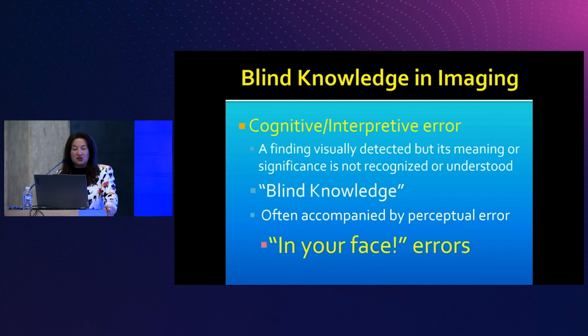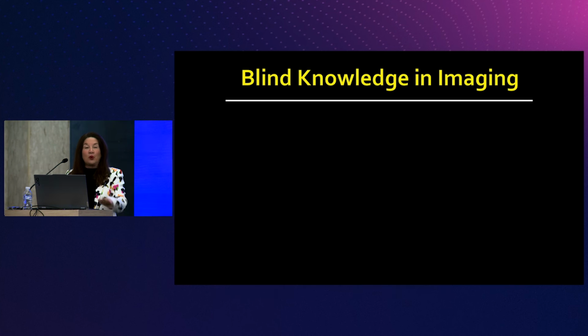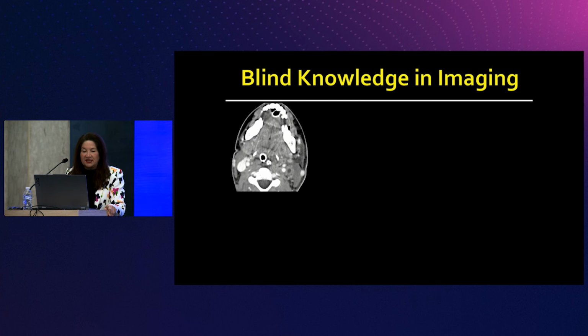And honestly, a lot of these are just in your face. They're just very, very big errors. We all have them. Nobody practicing doesn't have errors. That's why we call these learning opportunities. So let's look at a bunch of missed findings here.